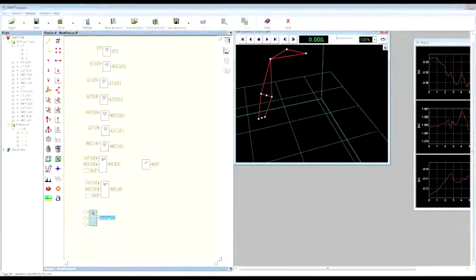In this case, you can see that this operator requires 3 inputs, and they will be the 3 points. So in this case, they will be the right acromion, the middle point between the lateral and the medial epicondyle of the elbow, and the mid wrist point. Remember that you have to use as the second input the marker that is at the vertex of the angle that you want to compute.